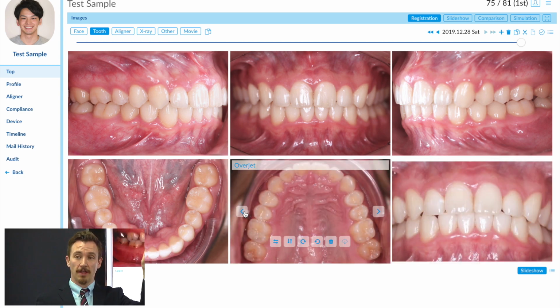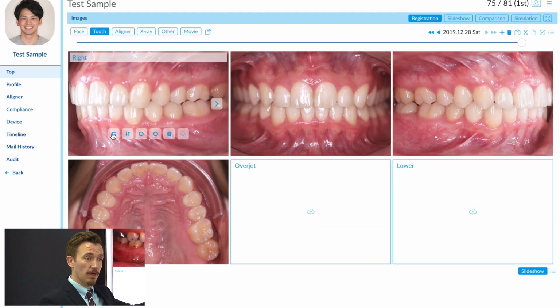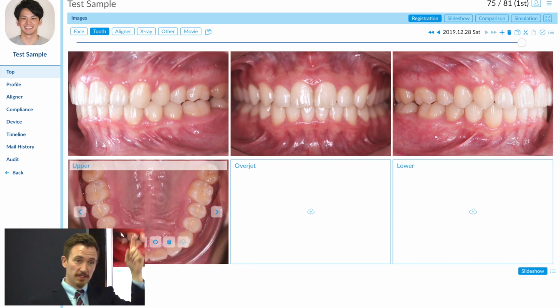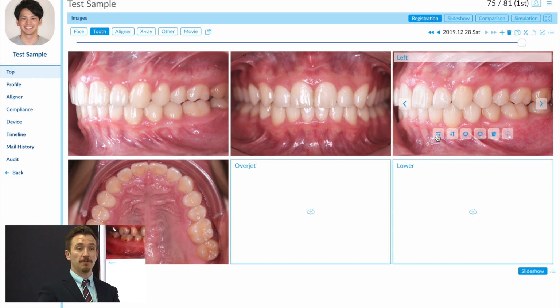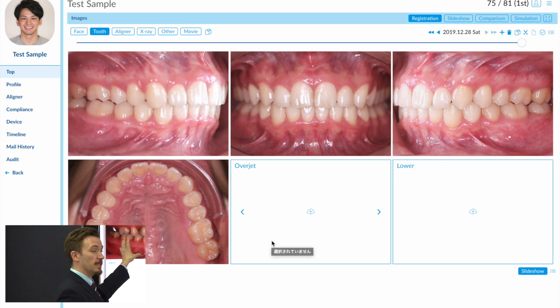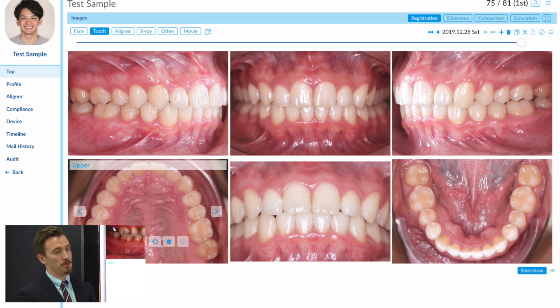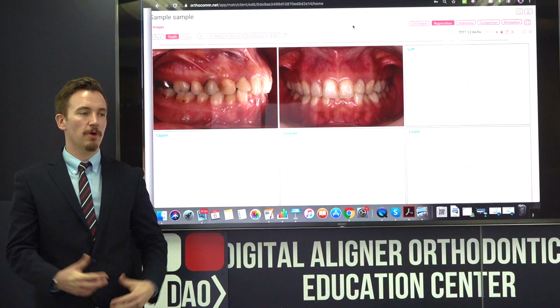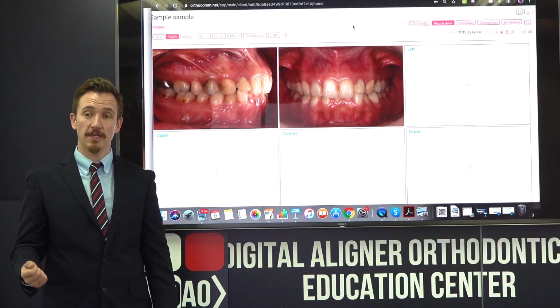There is also the ability to select a number of photos within a single folder and throw them all into the cloud at once. They will upload from left to right in the order in which they've been selected and added. Once you've uploaded your photo, if, say, you've taken the photo in a mirror, you can use the photo settings by hovering your mouse over each photo to either reverse the orientation of the photo, rotate it, or change its position.